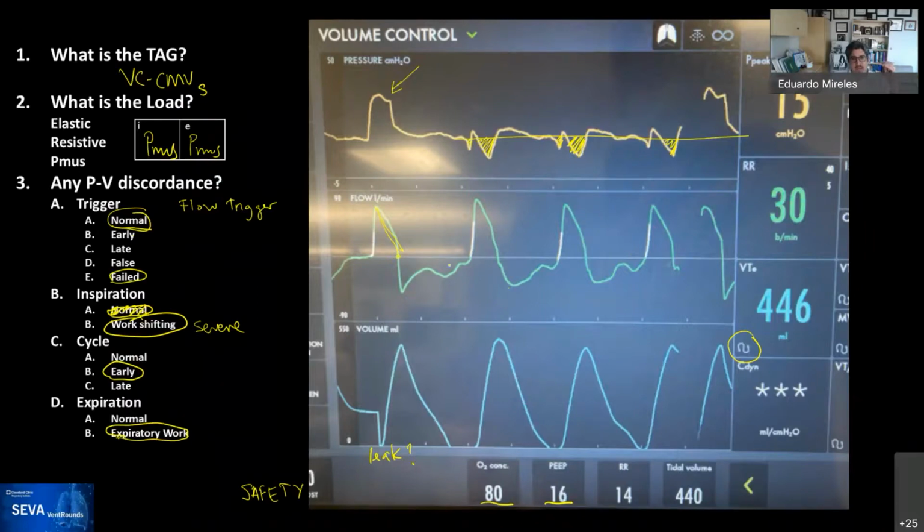But as you pointed out, there is evidence that the patient is trying to inhale at a faster rate than the ventilator is capturing. Sometimes this can be a failed trigger, or it can also be, and we have seen this, that the patient is actively exhaling. So it goes from inspiration to expiration, then it relaxes, and then it tries to exhale again, and then inhale, and it keeps going back and forth. But just by reading this waveform without being able to see the patient's dynamics, I agree with your failed reading, and this one as a normal.